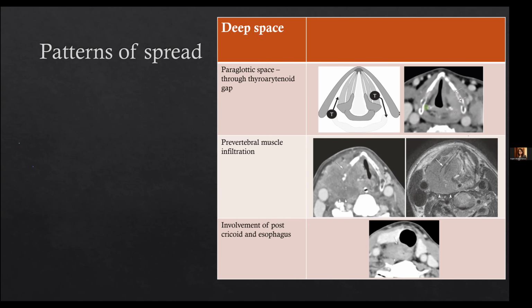But I would presume that in any form, if there is a diffusion restriction, obviously it represents a tumor recurrence, because there is a tightly packed clump of cells which is causing the diffusion restriction. So definitely diffusion will give you an idea whether there is a new lesion, especially in case of NI-RADS, because the anatomy itself is so distorted, the fat planes are so distorted, that it sometimes becomes very difficult on CT to say whether it's fibrosis or disease recurrence. And obviously, if the disease is showing diffusion restriction, fibrosis never shows diffusion restriction, then it becomes easier to identify.